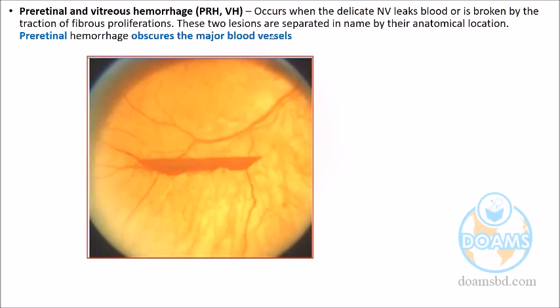So this is a very simple clue that this is pre-retinal hemorrhage. And pre-retinal means it could be vitreous hemorrhage. It could be hemorrhage due to many other issues, some medical diseases also. There may be coagulopathy, or maybe local retinal diseases, rupture of the retina, which causes the bleeding.